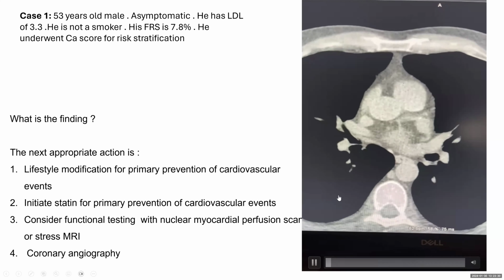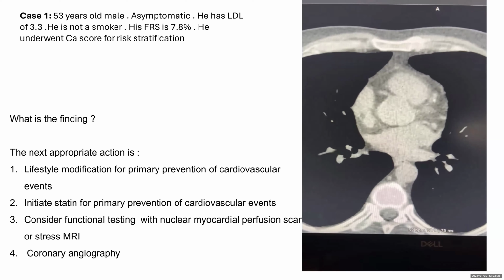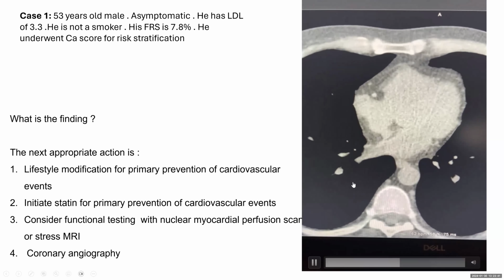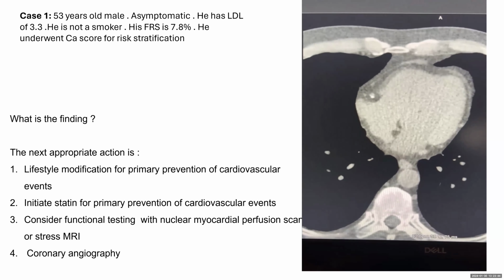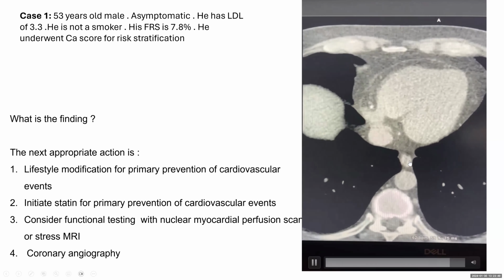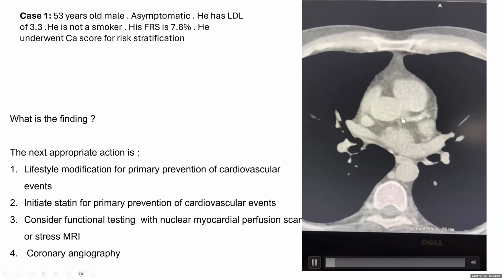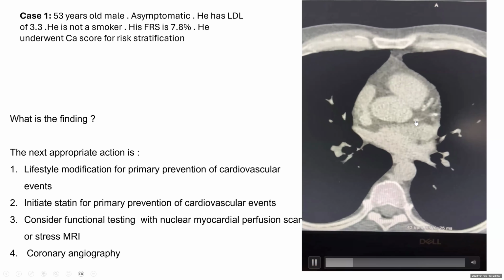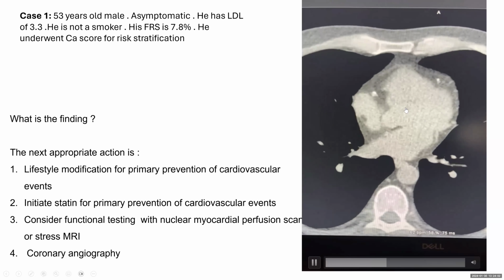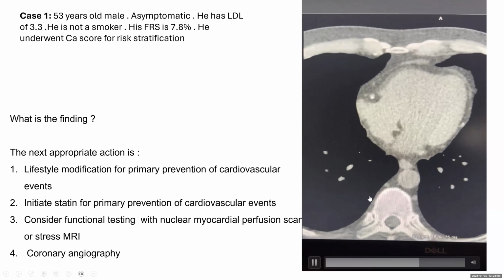This is his coronary CTA with calcification. And I want you to go through this and watch carefully what you see. I don't know if you guys are doing this or not, but this is the sequence of calcium score, and we can see the calcification appearing in spots 1, 2, 3 in the left main, LCX, in the LAD, in the diagonal, as well as in the RCA. So the patient has calcification in all 3 of his coronary arteries.